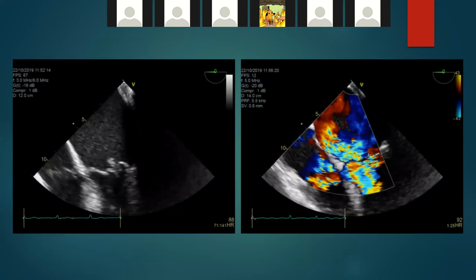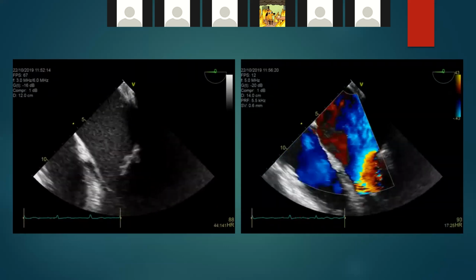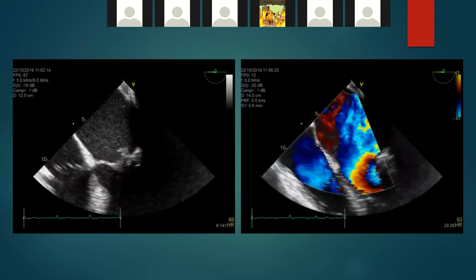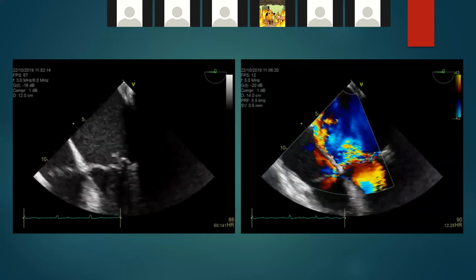But Michelle, we can't see that previous view, can we? We can't see the actual problem. No, we can. It's just that I've given you the magnified version now, in the same view, with a better color box.